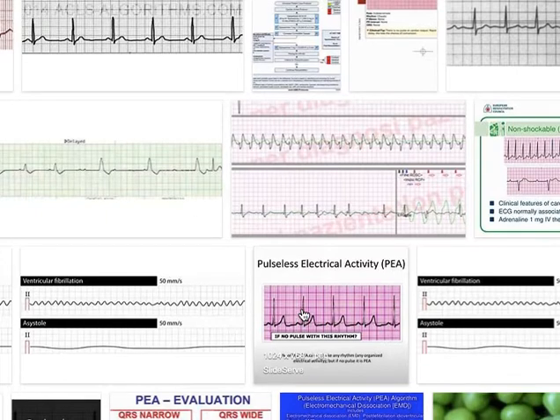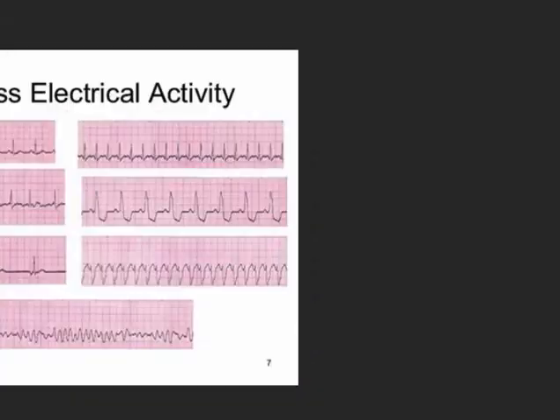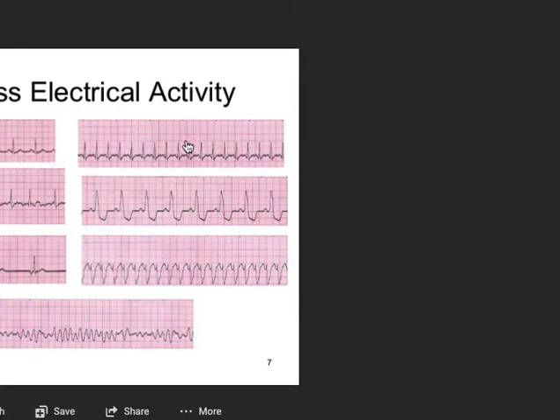There are many such ECGs you can find on the internet. The heart rhythm in this case is indistinguishable from a heart rhythm normally compatible with life.